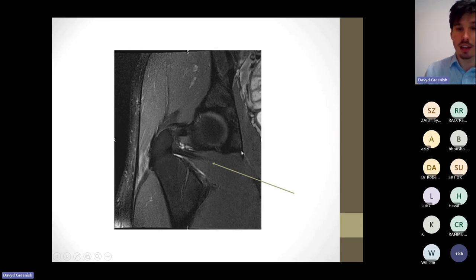But I would look at this and think, okay, I'm in the pelvis, I can see the hip, and I can see probably around the level of the obturator foramen there. Yeah, that's not a bad shout at all. So yeah, this is really tricky. We're around the level of the obturator foramen.